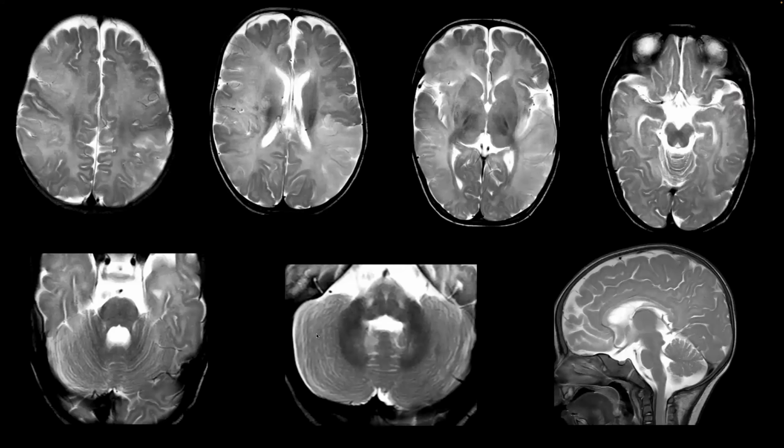So, acute onset illness. The MRI was done after 7 days, so 7 days after the SVT. Okay, I have the T2s. There is extensive involvement of the bilateral hemispheres, with cortical involvement, white matter involvement, and deep brain nuclei involvement, predominantly involving the frontal and temporal lobes. Again, bilateral involvement, slightly asymmetrical along the deep brain nuclei.